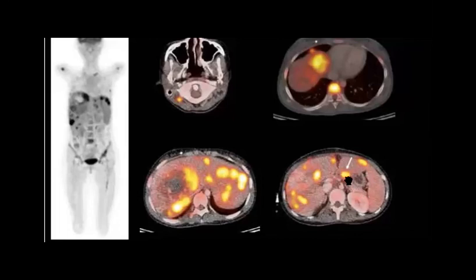What is this structure going here? Alaa, perfect. It can be the pancreas. Sure, in this case, you will check image by image, and you will see exactly where. Also here, maybe something in the lung, right?